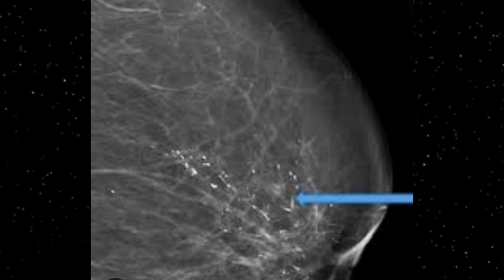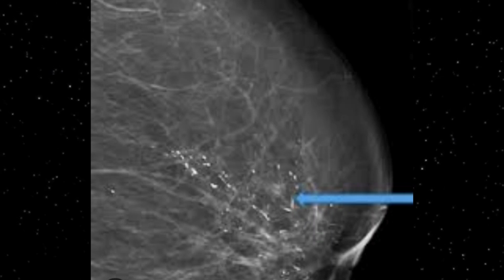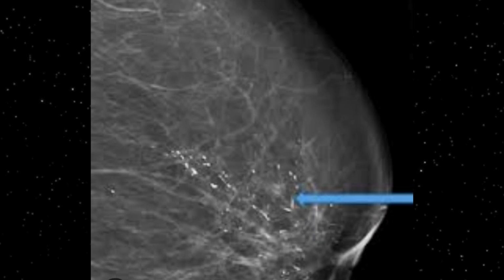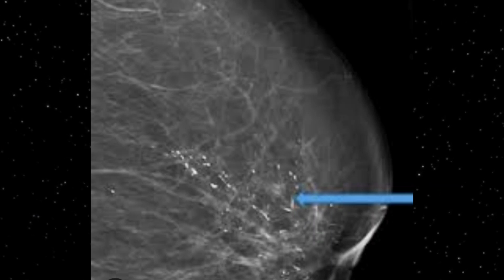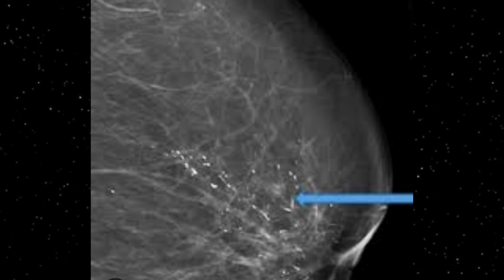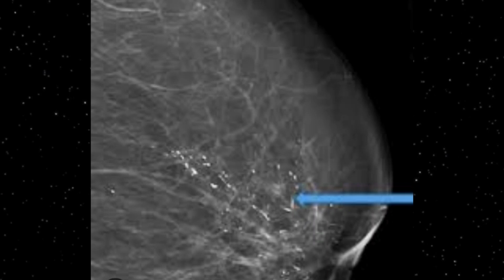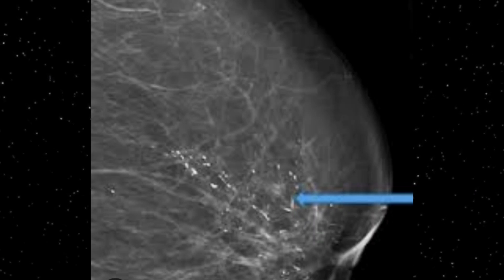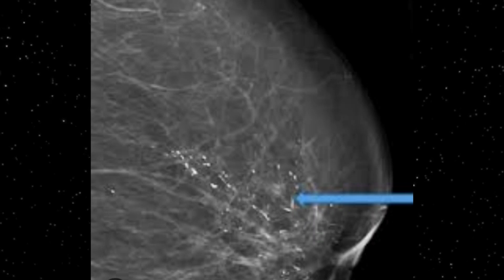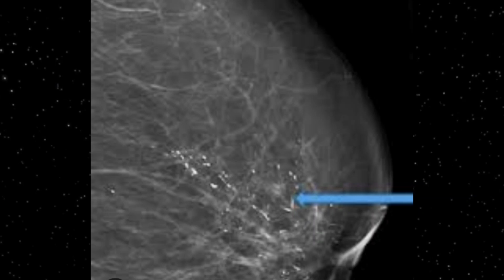It will appear like a lead pipe, which comes out of the duct and penetrates into the fatty tissues, leading to an inflammatory response, and again this gives rise to calcification. So all these three forms would be benign, and they give rise to calcification which would be macrocalcification and benign in nature.